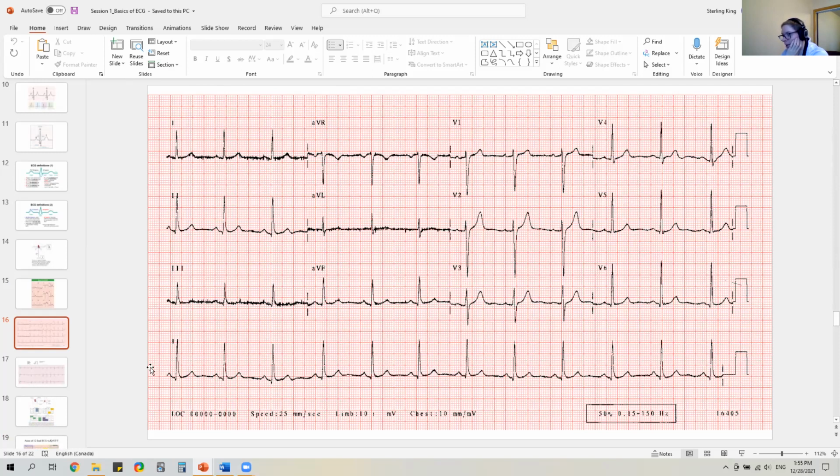Lead 2 is at the bottom here, and it goes across the whole page. This is all lead 2. This is usually where you'd be counting your heart rates and figuring out the rhythms, because it's the constant. Over here, we can see lead 1 is going up mostly, so normal ECG. Lead 2 is also mostly going up. Same for lead 3. And AVR is going the opposite way, that's correct, so that's normal. AVL is going up mostly. AVF is going up mostly.